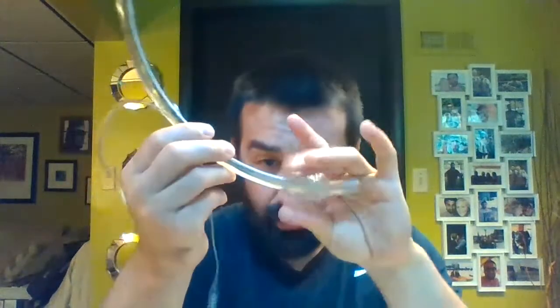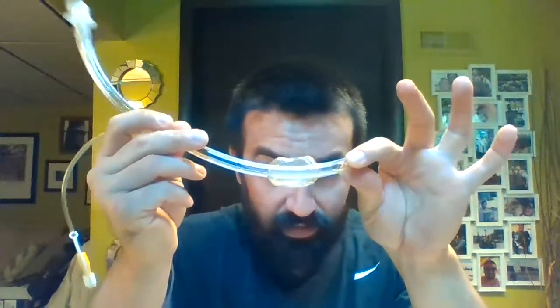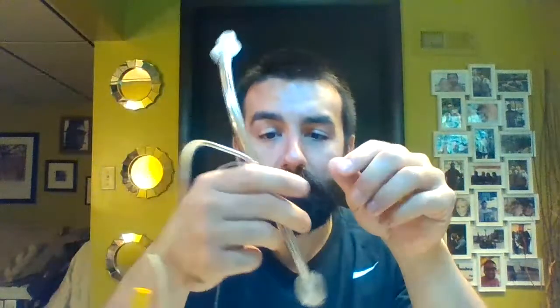We have our cuff here. You can see I have this partially inflated. We talked about methods for inflation. You can see my beveled end here, and then I have the Murphy's eye. The Murphy eye is there in case we get a distal occlusion of that airway, so we still have the ability to pass air through. We also have a radiopaque line, which allows us to see this on a chest x-ray.